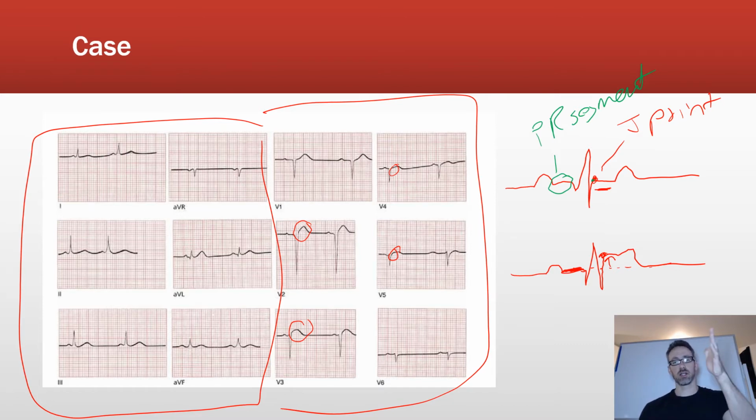And in the cardiology course, I'll talk about ST segment elevations that could indicate something other than an infarct. But in this case, this is somebody with chest pain, troponins were at a high level, and so we see ST segment elevations in V2, 3, and maybe 4 and 5 as well.